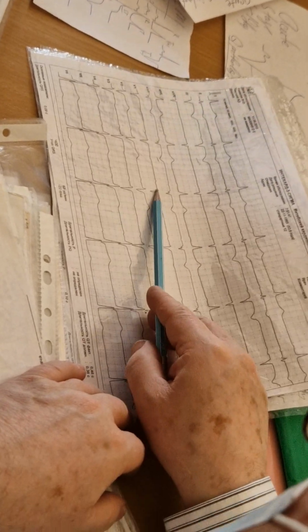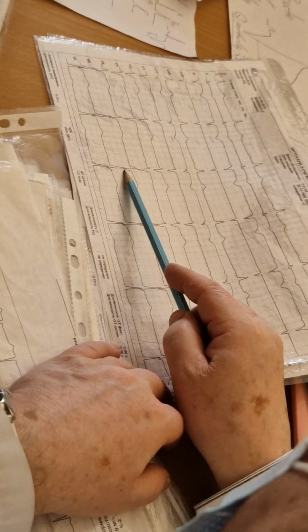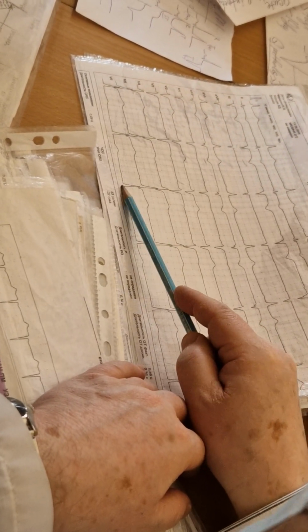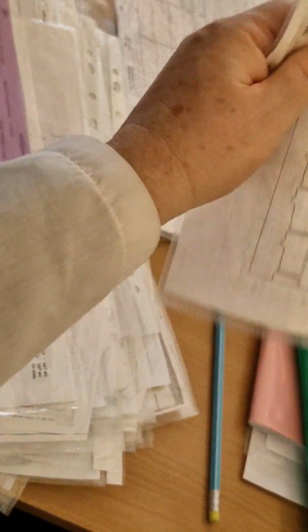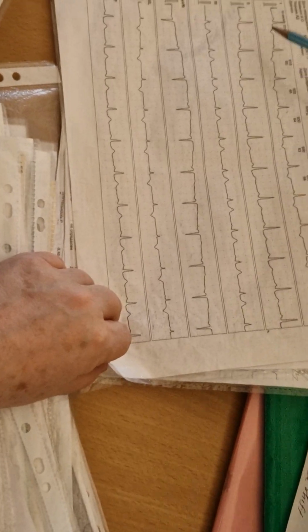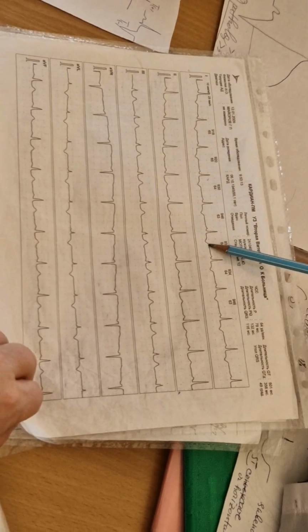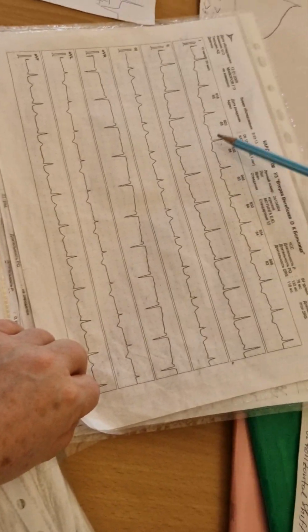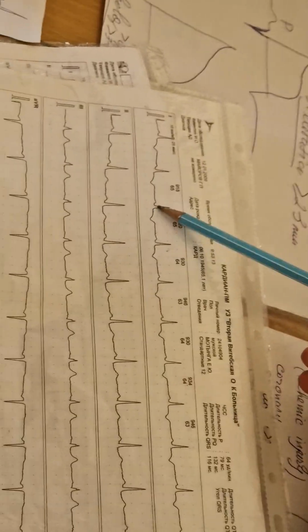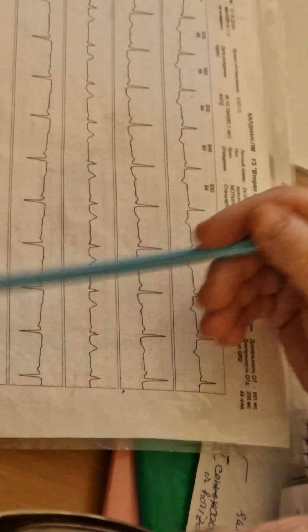A small R wave is present here, no, this is a deep S wave, like right here. Here may be left ventricle hypertrophy, because you see RV5-6 is more than RV4. To see this situation: chest leads, standard leads near normal, only a small negative T wave. In first standard, T wave should be positive. Maybe small ischemia or disorders in repolarization because of another problem. Others look normal.